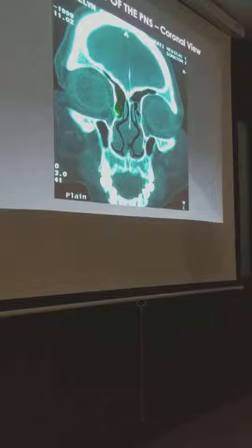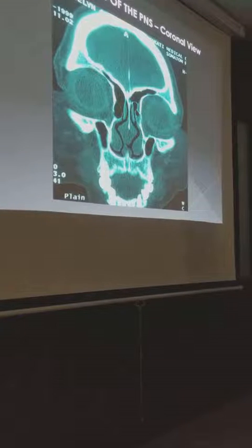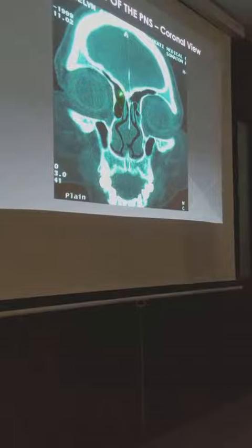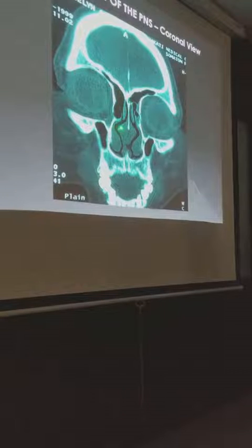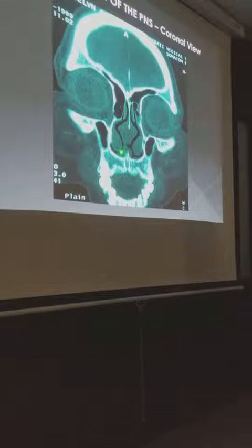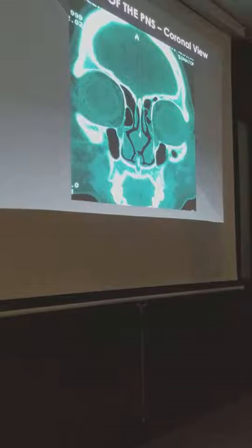Okay? So, anteriorly, it's the frontal process of the maxilla. So, sa likod yan, what would it be? It would be your infundibulum, the drainage. Superiorly, frontal recess. Inferior and medially would be what? The uncinate process. Okay? Agree? Uncinate process. Next slide, please. So again, okay?